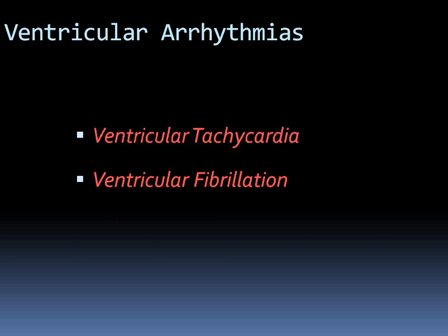Now, we're going to go over some examples of ventricular tachycardia and ventricular fibrillation. Remember one other thing: when we interpret ECGs, a lot of it is pattern recognition also. You just cannot sit there and fine-tune and analyze every detail in an EKG. It is the overall picture that matters.